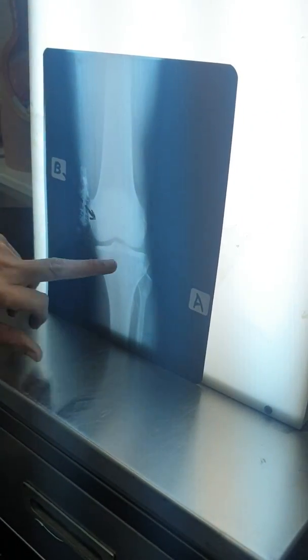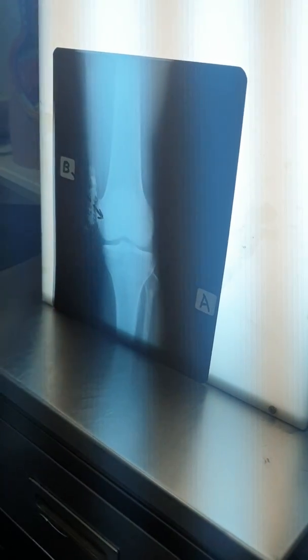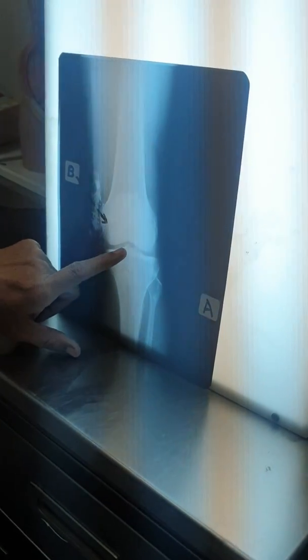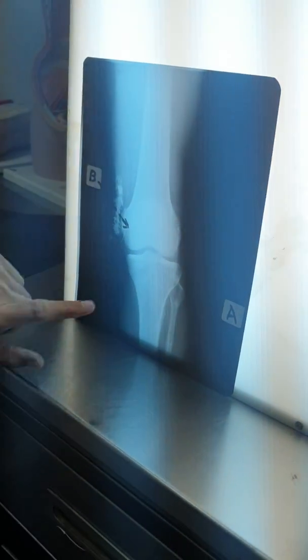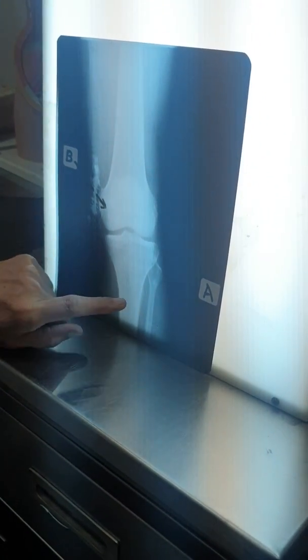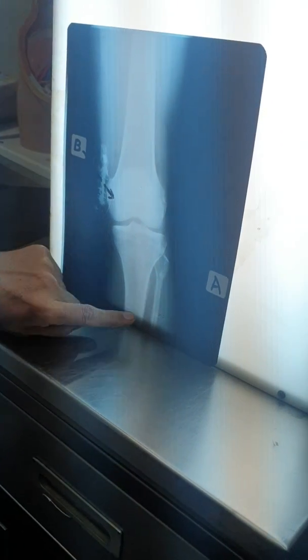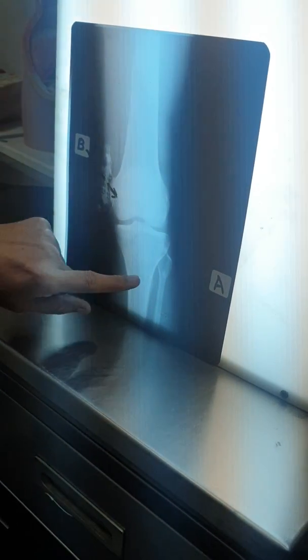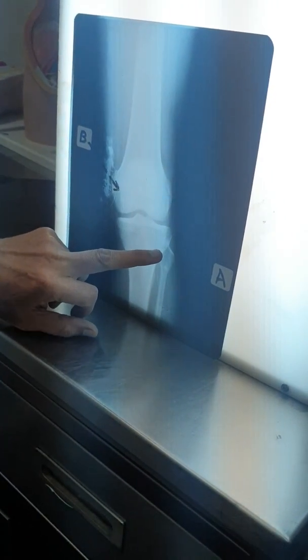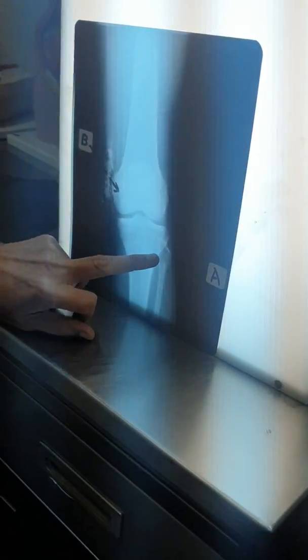So these are the 2 epicondyles, and these are the condyles of the tibia. These are the condyles of the femur. Epicondyles, and this is the intercondylar area with two tibial spines. This shadow you see is the tibial tuberosity. This is the upper end of the fibula, and downwards there is a small joint on the lateral side. There is a facet on the back of the epicondyles.